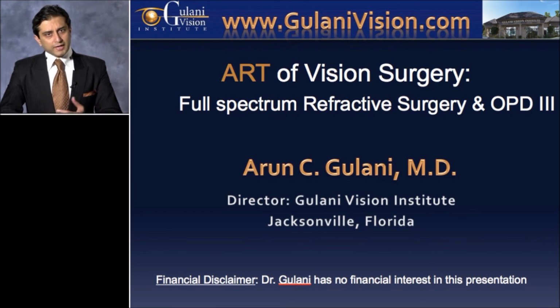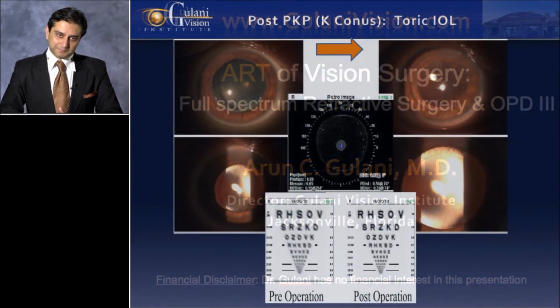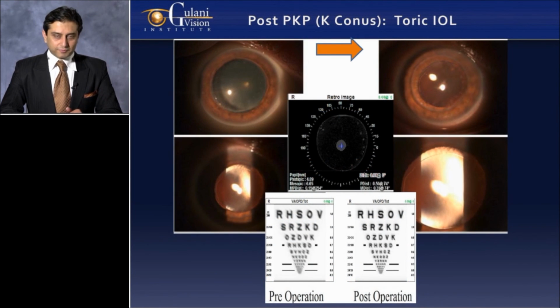Let us look at some of the cases now which were referred to me as complex, difficult, complications, whatever you call it. And my trend is always to look at each case as, well, let's solve the mystery here. Let's see what's going on, and yet don't give up on the conscious effort to always aim for emmetropia. So let's take our first case scenario here.